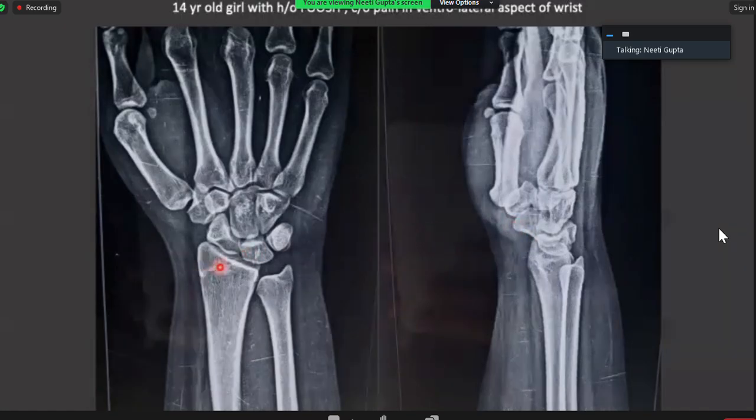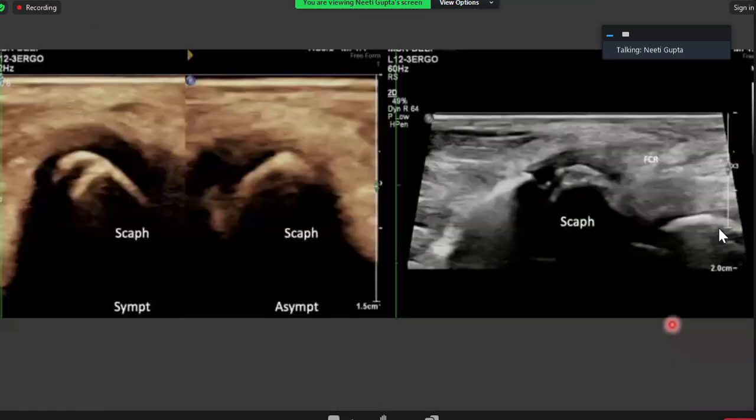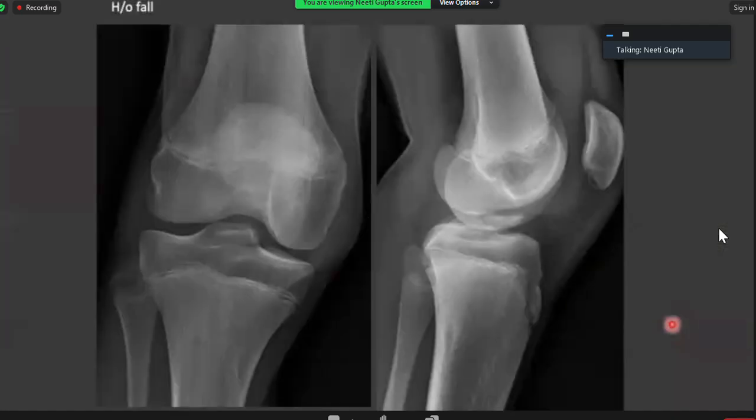Even I was focusing on the distal radius, but I was quite sure that this is a normal physeal plate which is still getting fused. So this is not a fracture. This is the fracture, and this was the cause of ventrolateral pain in the patient. So be careful. Always correlate various modalities in case of doubt. And again, you can use the contralateral side for comparison.